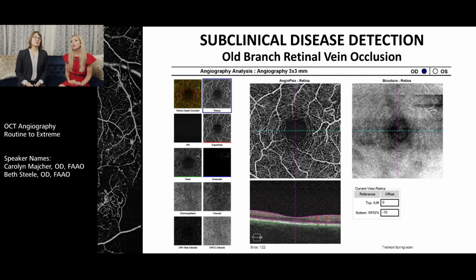And in this example, the other thing to highlight is that once you see this abnormality, it's important to be sure that it is in fact a collateral and nothing that actually needs treatment. So if we highlight the area of the vitreoretinal interface, which is not magnified in this image, but you can see in the smaller thumbnails to the left, that there's nothing there. And that's exactly what we would expect when there's not retinal neovascularization. So of course, this does help us confirm and be a little less urgent in our thoughts about what's actually going on here with this patient. Yeah, differentiating collaterals versus preretinal neovascularization, which is a very important distinction to make because it affects your management.